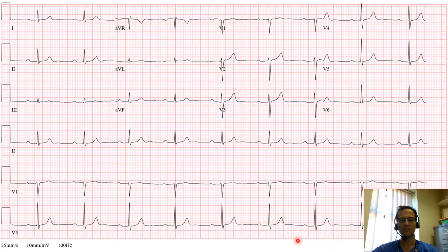So this is our first ECG. I'm sure you run through a series of things in your mind when you check a new ECG, like the date it's been taken, like the patient information, check it's all correct. And then you move on to look at the atrial activity, followed by the QRS duration and axis, and then look for interpretation of specific features. So looking at this ECG, what is the abnormality?